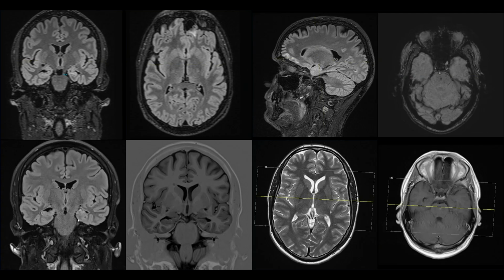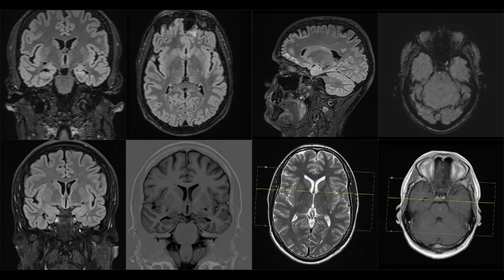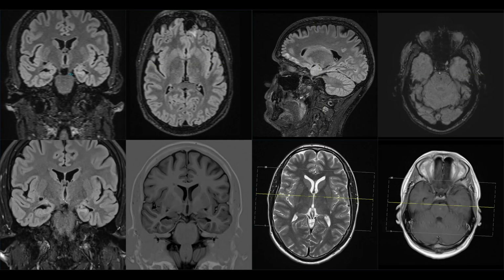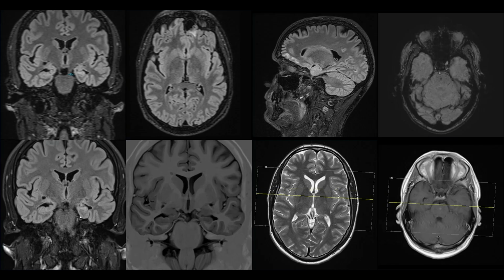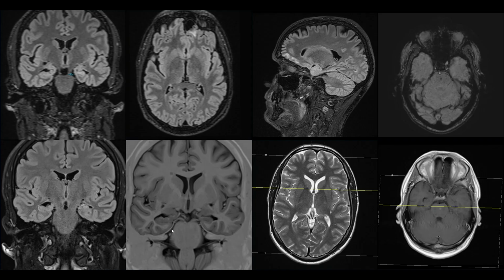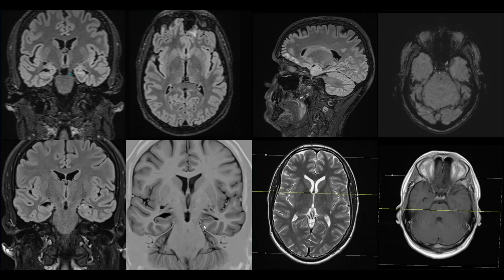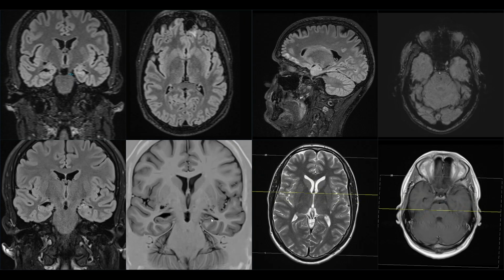We have previously described the same finding as we can see here in the left hippocampus that is showing signs of atrophy. It is smaller in volume, as well as on this coronal FLAIR sequence showing the higher signal intensity. This is a very nice sequence, the inversion recovery, very sensitive for anatomical structures that should always be included in the evaluation of epilepsy patients.